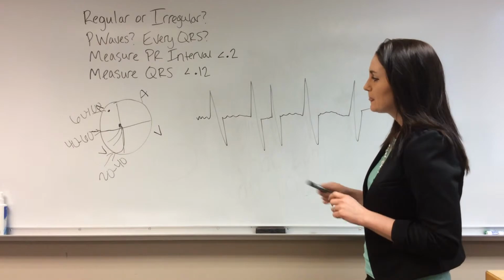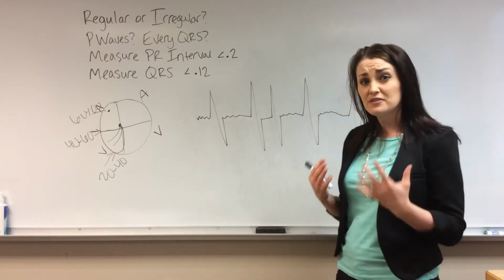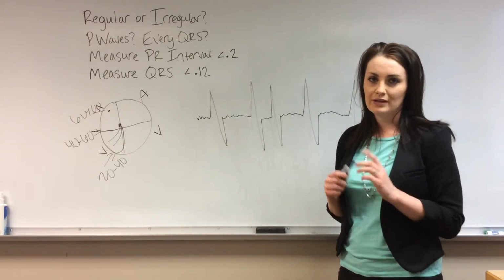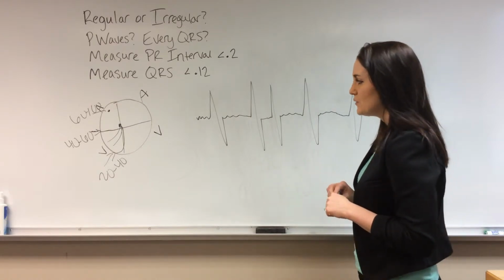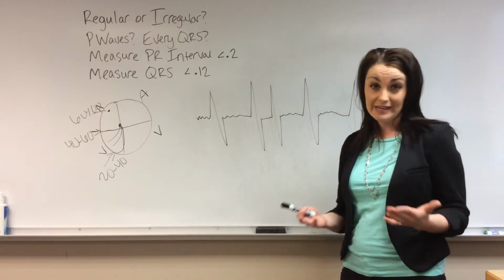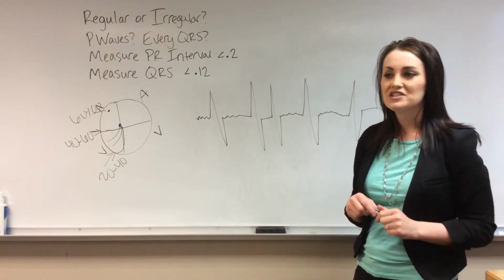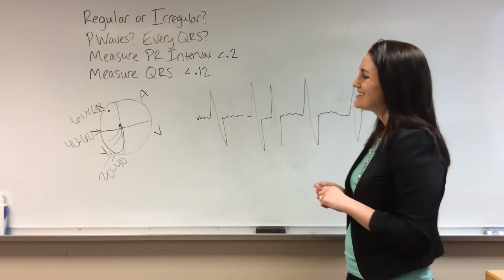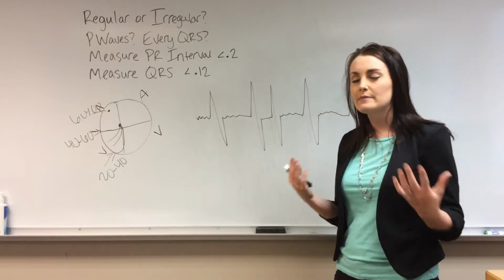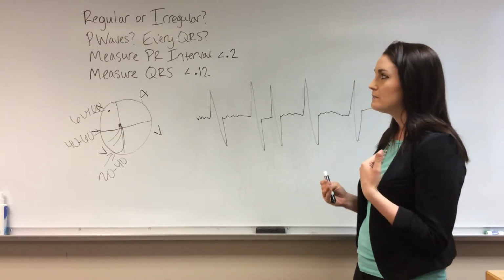And that's because the atria are not necessarily contracting to give you a P wave. There are no discernible P waves with AFib. We always say in cardiac ICU that if you're trying to talk yourself into a P wave, it probably isn't one. And you're looking at, is it junctional, is it atrial fibrillation, but it's probably not sinus rhythm. So with atrial fib, there's no discernible P wave, so there's no way to measure a PR interval because there's no P wave.